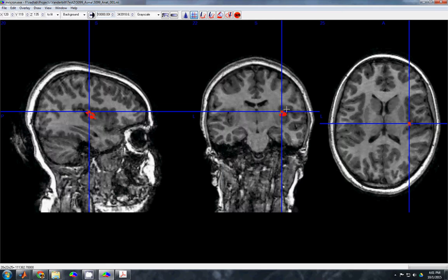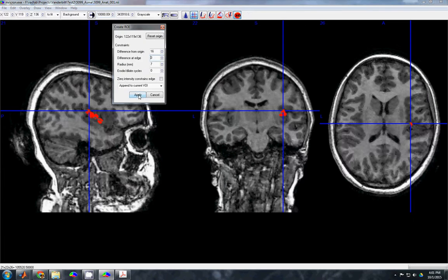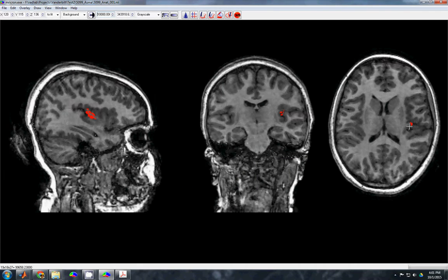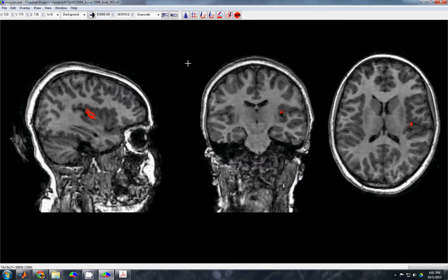You can also check that it's going far enough dorsally, like maybe I want to make sure I capture this bit up here. Good. I might want to look at the sagittal side and press delete to toggle crosshairs and realize, oh, maybe I should be capturing around the edge there. I have to raise the threshold a bit to let it go forward, raise the radius. Just try to really sink in there and capture every bit of it.